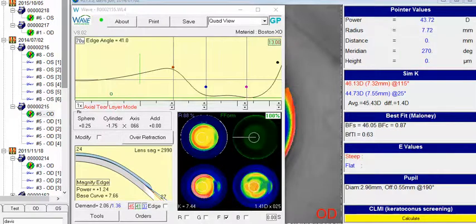Mike, this is a follow-up video. Looking at loaded Wave on a different computer. This is the most up-to-date version of Wave, and I downloaded those files again, and still I'm seeing the same lens that we originally did the video from.